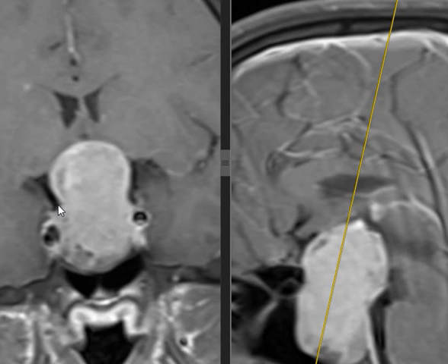What hormone do you think is elevated? Prolactin, growth hormone, TSH. What hormone is it, because it's pituitary? Prolactin. Why? What did you see that suggests this is a prolactinoma?